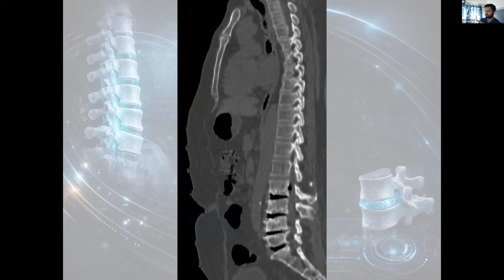And a few extra pathologies, I have added 1 or 2 slides. What abnormalities do you see here? This is quite black. This is air, which is nothing but nitrogen. In degenerative disc disease, you can see this in X-rays also. We have seen 1 or 2 cases here. In MRI also you can see a little bit of a black structure. CT also you can see. In case of any degenerative disc disease, this disc is filled by nitrogen, which is showing very black in the CT.